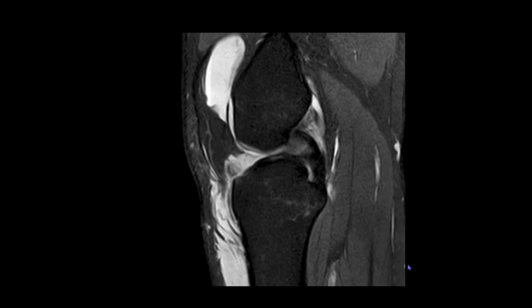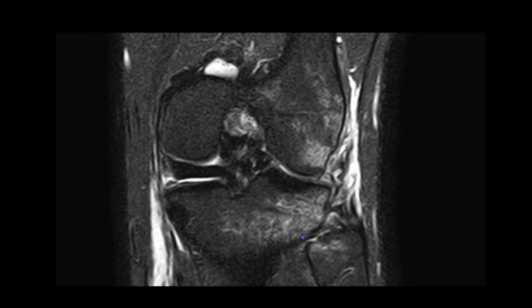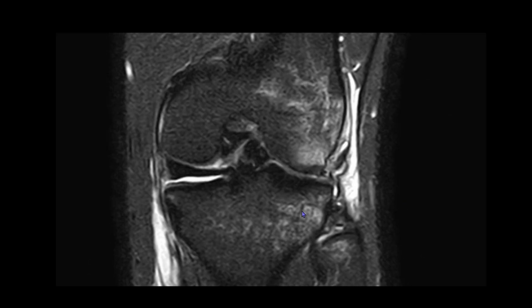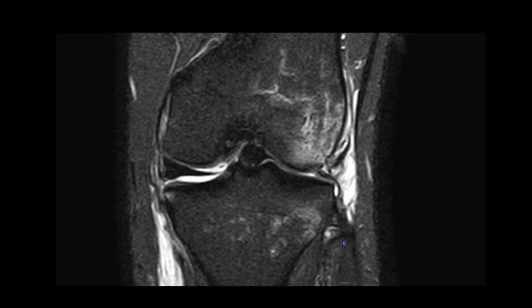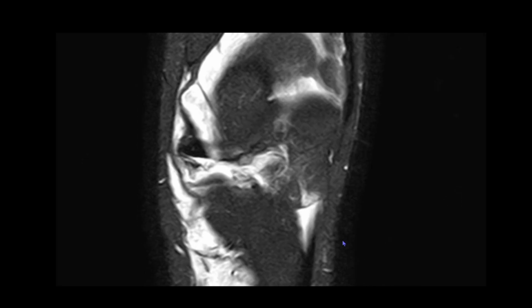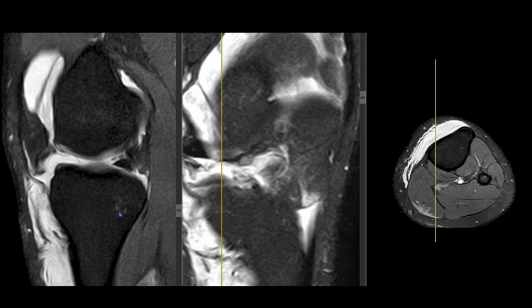Now coming on to the menisci, we'll first start with the medial meniscus. So this would be the medial aspect, and there's the fibula, that's the lateral aspect. Looking onto the medial aspect, we are able to see the meniscus, and the bow tie appearance of the meniscus is maintained. Going on to the anterior aspect, here we are able to correlate the images.